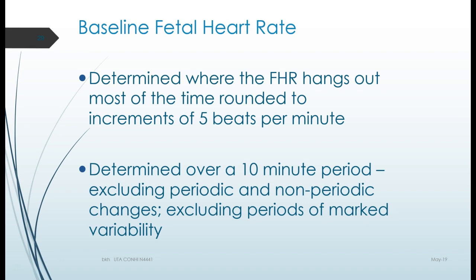When we're looking at baseline, we have to look at baseline when there are not any contractions happening and when we don't have a period of a big increase in fetal heart rate, like an episode of an increase or some type of a deceleration. And you're going to learn to define those. But to start with, the easiest way, and I think I told you in part 1, the easiest way to learn how to look at this fetal monitor strip is go one page at a time and let it build on top of each other so that by the end, this is going to make sense.